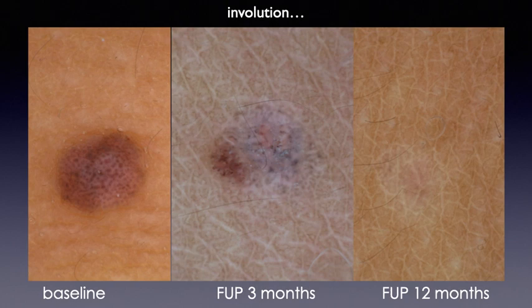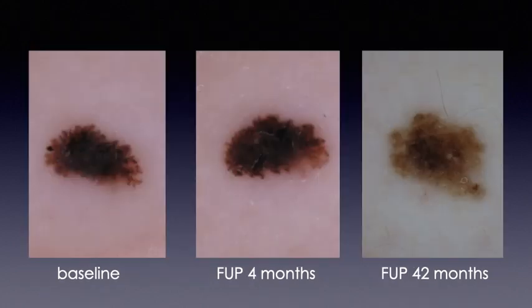During follow-up of this lesion we can see a stabilization and then disappearance of the dermoscopic pattern, or a simple stabilization, so that at the end of the evolutionary process, the lesion is no longer recognizable as spitzoid in dermoscopy.